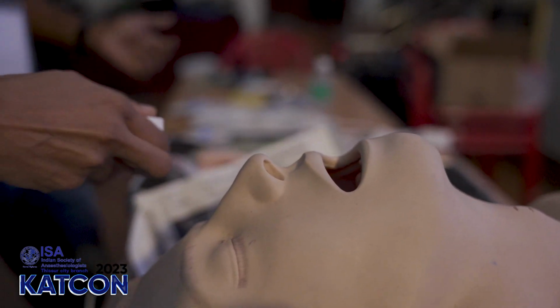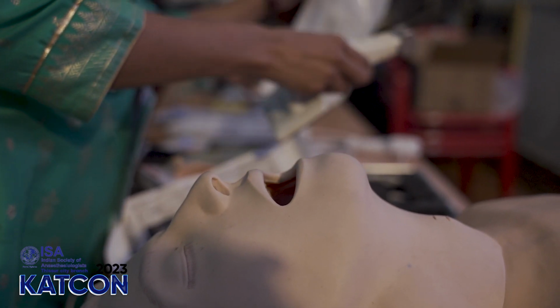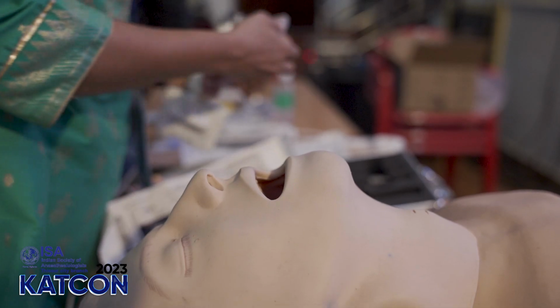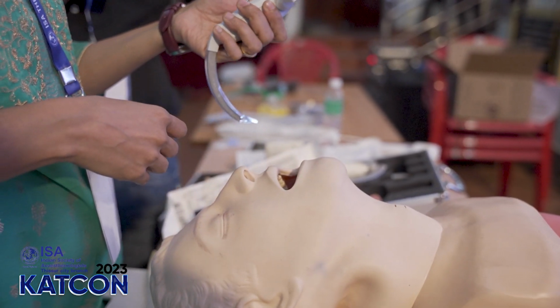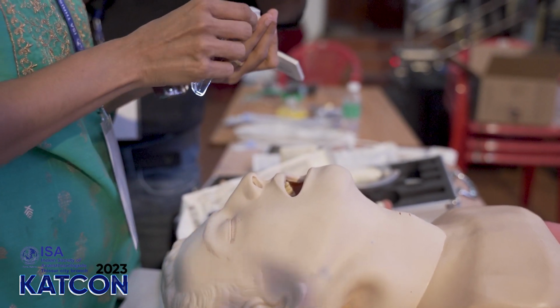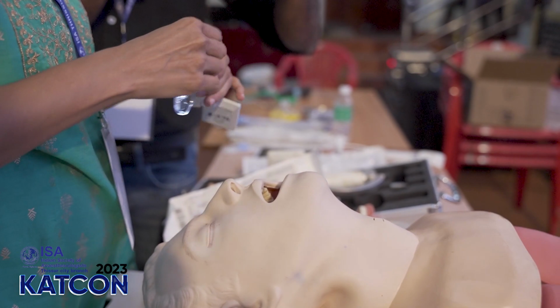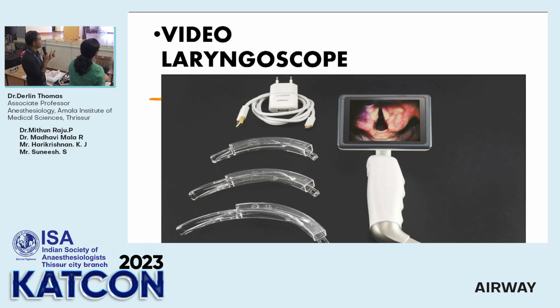Next advanced device available is a video laryngoscope. Multiple devices have come now. We have with us the McGrath blade. This one is the McGrath video laryngoscope. For this, you need to attach the blades into the video laryngoscope. Now we have channeled ones and non-channeled ones. This is a non-channeled one.